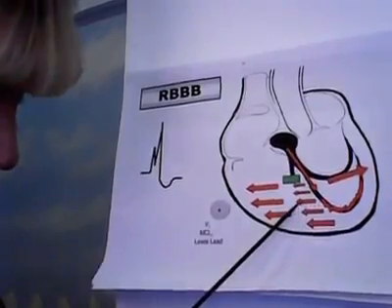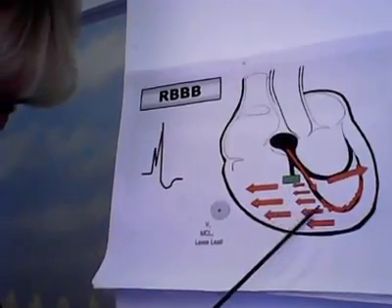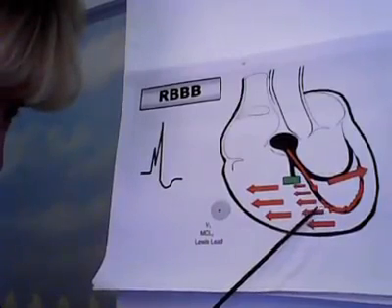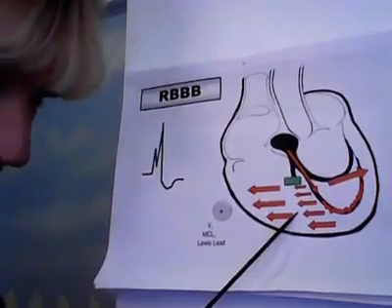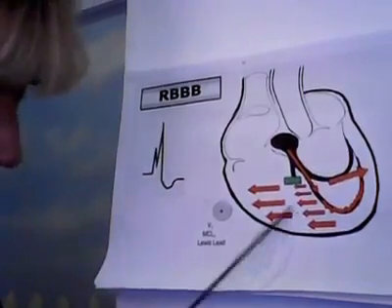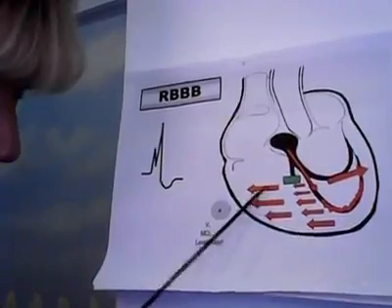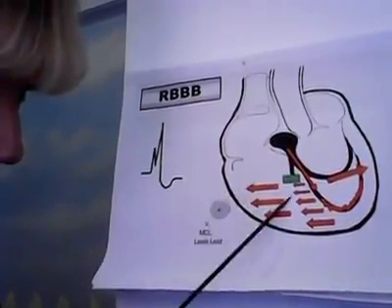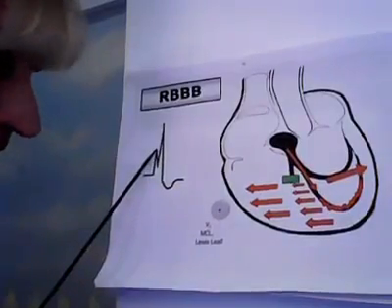When these guys cross over, they usually jump on the right bundle, but it's blocked. So when they cross over the anterior septal wall, they're like, hey, what are we going to do now? Oh, I don't know. We got to go from cell to cell to let everyone know we're here. So that's what they do. They go from cell to cell. Hey, we're here, we're here, we're here. Pretty soon we're going to contract. As they're traveling in this direction towards the positive sticky, the complex goes up.